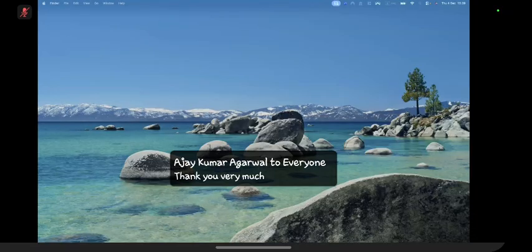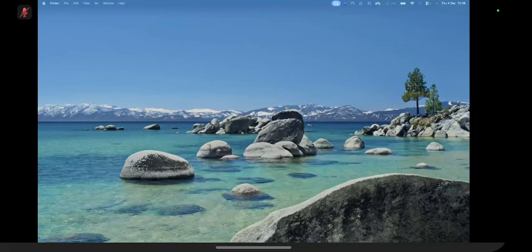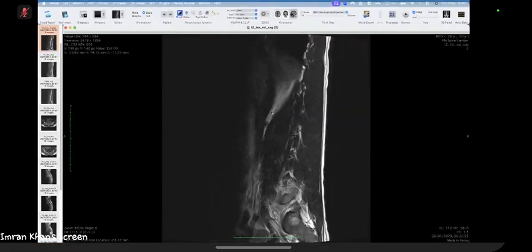So bone tumors, lymphomas, osteosarcomas, and Ewings, particularly Ewings, will show a lot of adjacent soft tissue mass around it as well, but the infiltrative mass is more typical of a lymphoma. Okay, and in this case the clue is not just the soft tissue mass. The clue is actually the significant volume of lymphadenopathy that you're seeing both in the mediastinum and in the presacral region. Just a recap, okay?